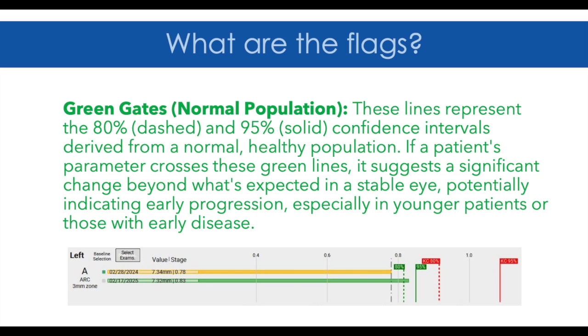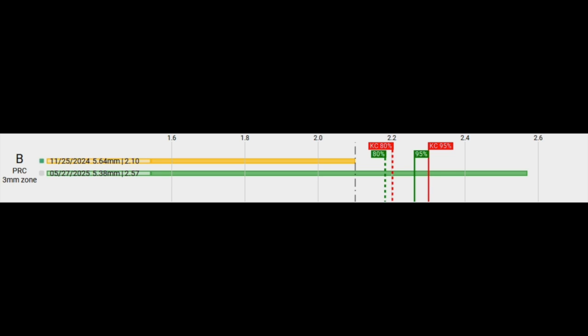Now, in this scan, you can see that the green flags then transition into the red flags. So in this one, the distinction is really clear and really easy between the normal and keratoconus population, but it is not always that way. So you'll see in this image that the normal patient population and the keratoconus patient population have a significant crossover.